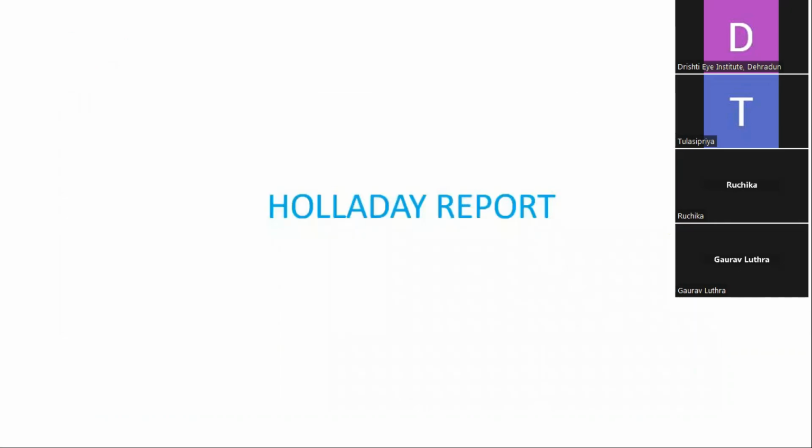So moving on to the Holladay report. This report is helpful in post LASIK or RK operated patients, especially where the anterior and posterior surface ratio is altered.